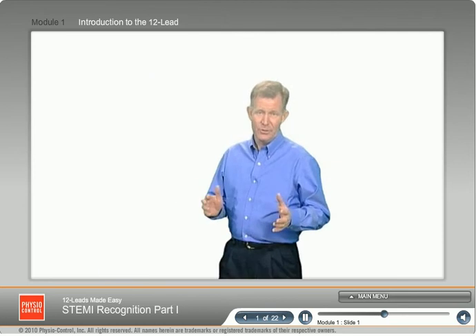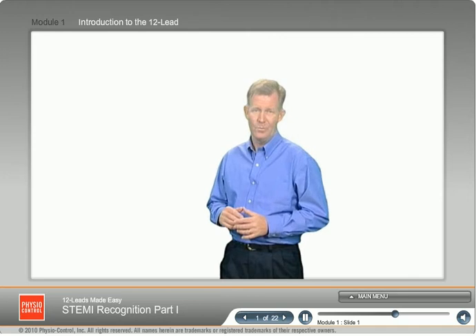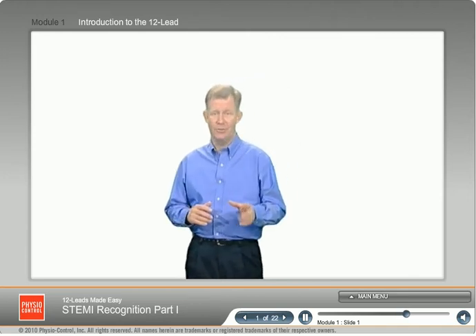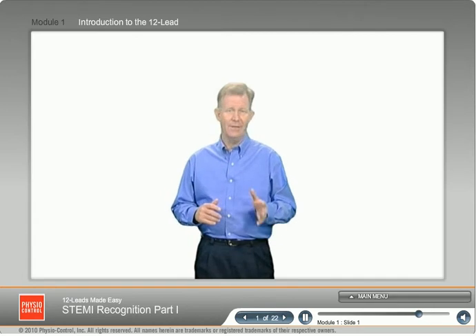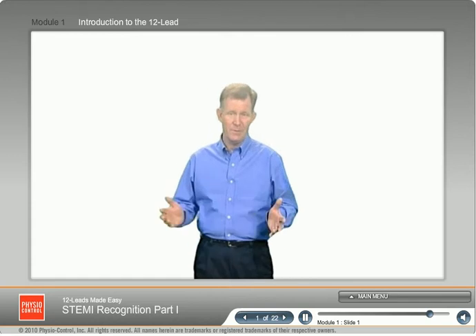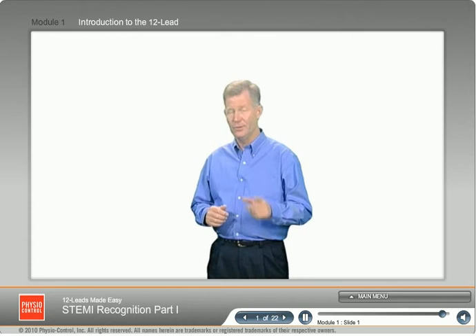If you're like me, you prefer to skip the preliminaries and jump right into the main event. Well, you're only a short time away from being able to recognize and localize acute myocardial infarction. However, before we can get started, we need a quick introduction to the 12 lead itself. So let's spend about 3 minutes looking at the 12 lead. Once you finish this short introduction, you'll be ready to go.